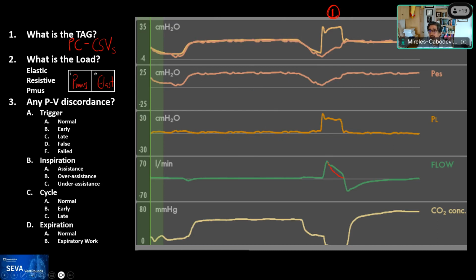Yes, Leora, that's correct. When we can't see the time scale, how do we tell how clinically? You can't. It's hard. So that's why I shared that it was a little bit tricky without a time scale to tell particularly how fast it was returning. But just looking at the inspiratory time, that's why I would say it seems like this is elastic. It's returning to baseline relatively fast. But yeah, you're correct.